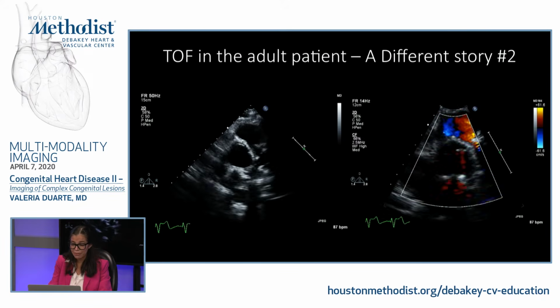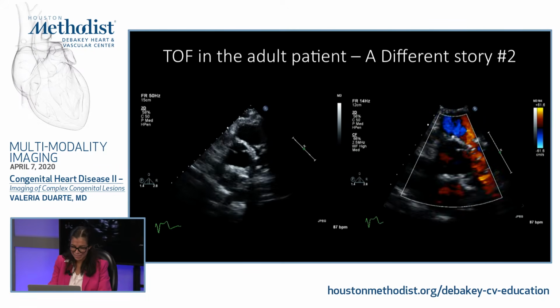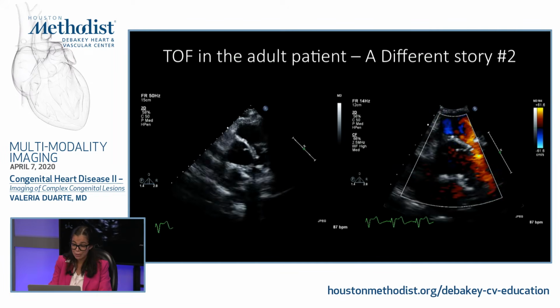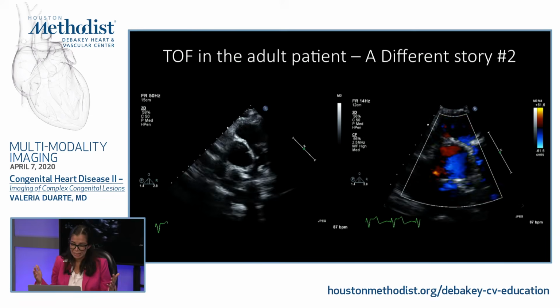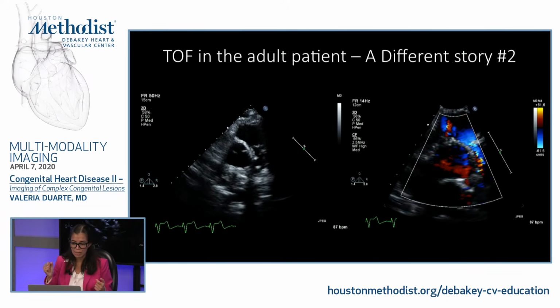And at first glance, I may not get very overwhelmed by it. Very frequently it's called mild pulmonary regurgitation. And the reason is because with severe pulmonary regurgitation, when it's wide open, there is no turbulence, there is equalization of pressures, so the flow sometimes is really short, so it's unimpressive.